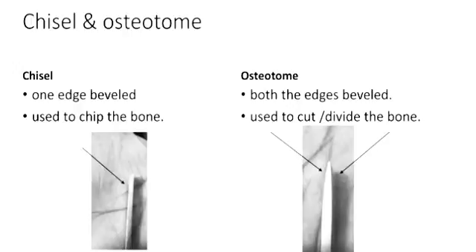Bone chisel, it is like an osteotome except that only one of its surfaces is beveled. It is used for removing a protruding bone or leveling a bone surface. Examples for leveling: excessive callus, removing an osteochondroma, etc.